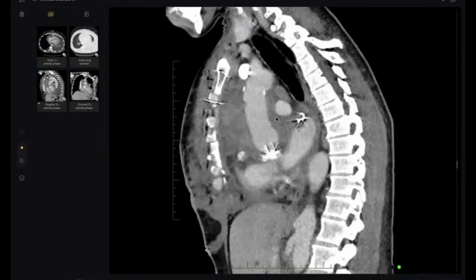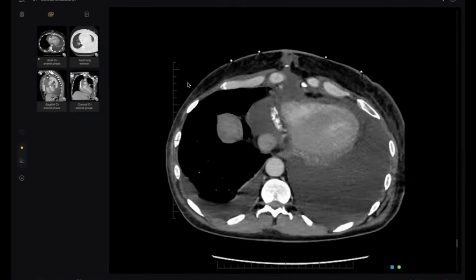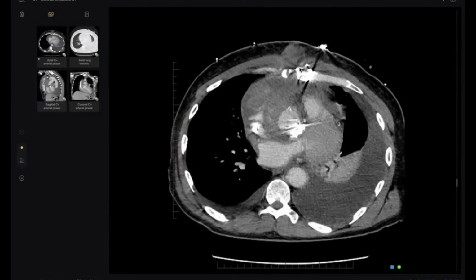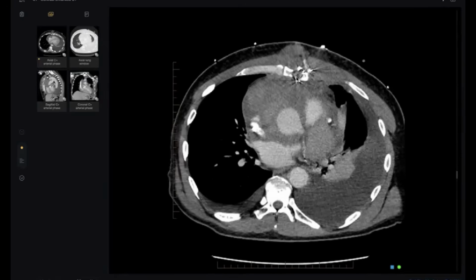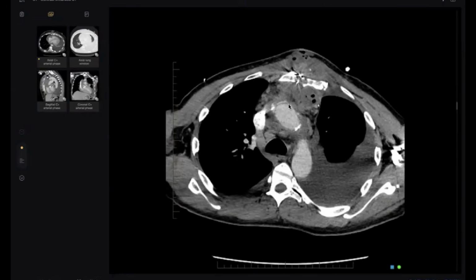Thank you, doctor, so much. I just bring this case because it is very unfamiliar for us what happened here. Even if the examiner didn't give you the history, and I expect many examiners have the right to do this, why? Because here there are many beam hardening artifacts, and the sternum looks abnormal. There is a defect here, so what happened? And look, there are soft tissue with gases.